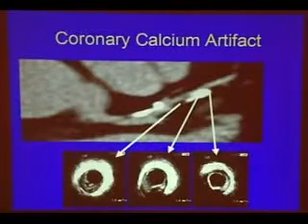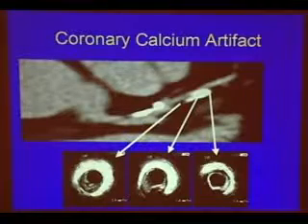This is just a correlation of CT with ultrasound.